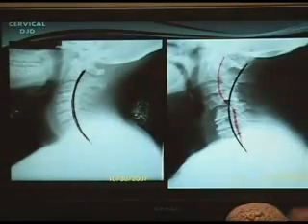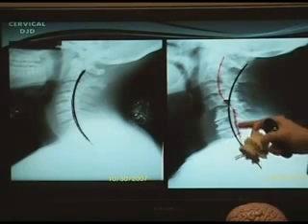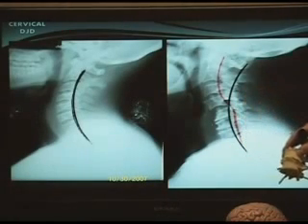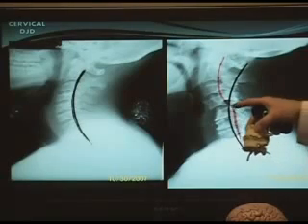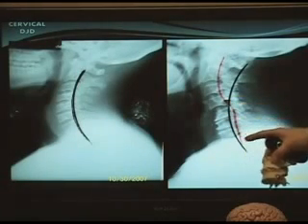This is phase three, and this is almost permanent. This is permanent at this point. We can't fix phase three. We can make a person feel better in phase three, but when they're in phase three, this is severe degenerative changes. This is years of poor spinal structure.